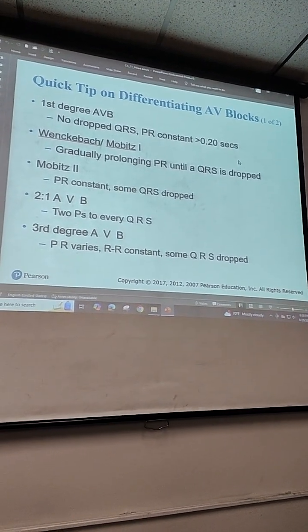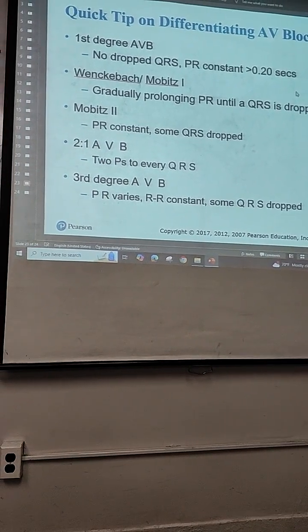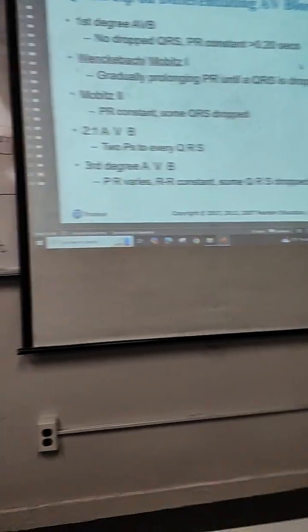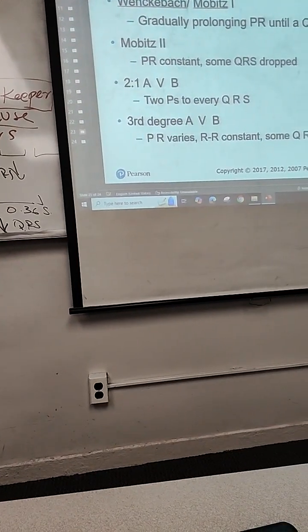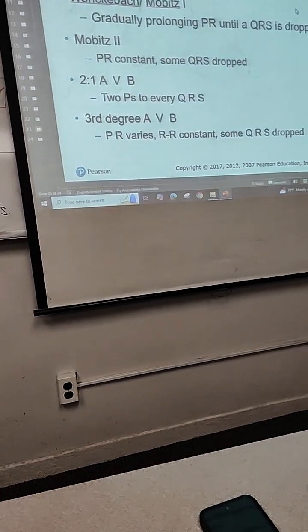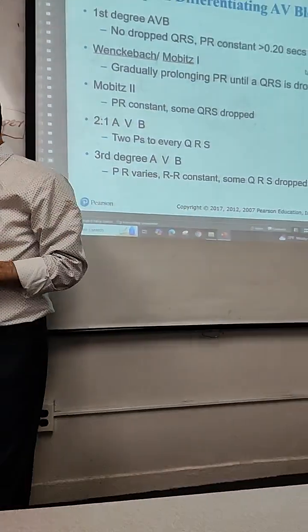It is constant, but it's not prolonged. Be careful with that. Constant, not prolonged. It has some dropping of the QRS.